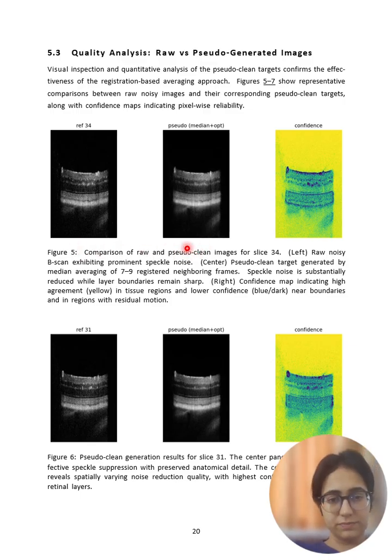The confidence map shows that the yellow part is where it is completely confident, and this part has also turned somewhat yellowish, and the bottom part is also yellowish. The edges are going to be blue because that is where the shift happens, but overall the quality and the difference between the images show that there is some improvement in the new jitter-free pseudo-clean image. This is another example of the same thing.